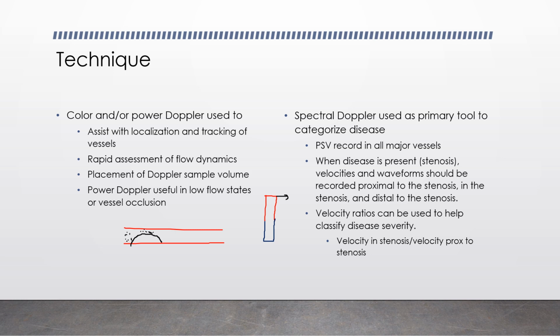The lack of color, however, can indicate that there is full occlusion, although you want to be very careful in making that determination, because even if a vessel is fully occluded, there's 0% of blood getting through that stenosis, that's typically considered inoperable.